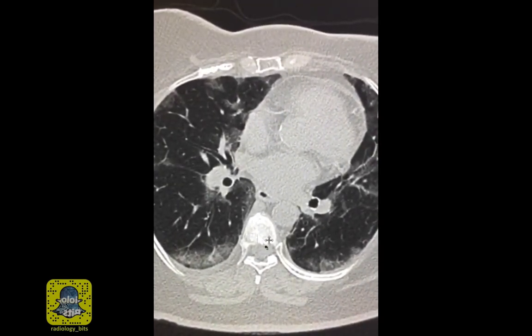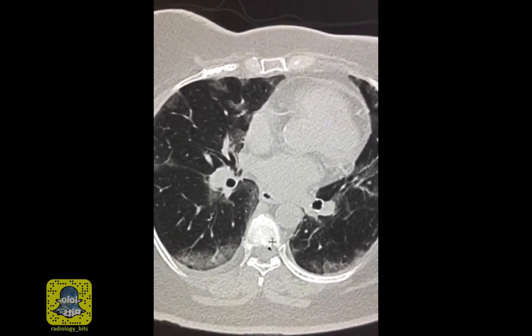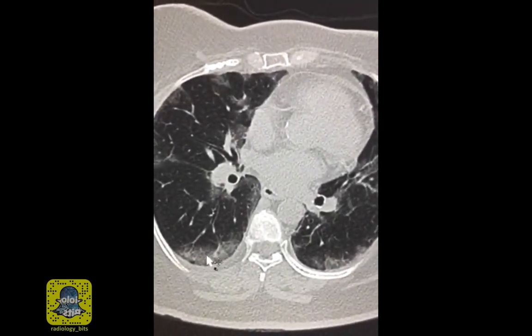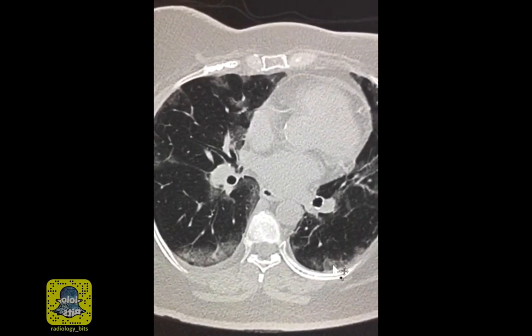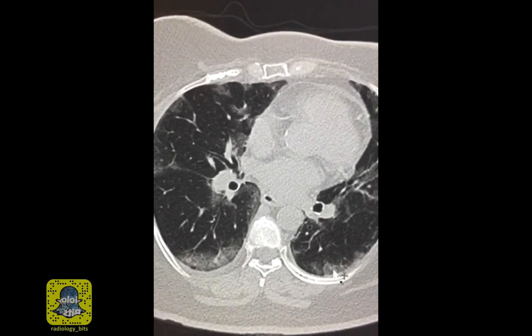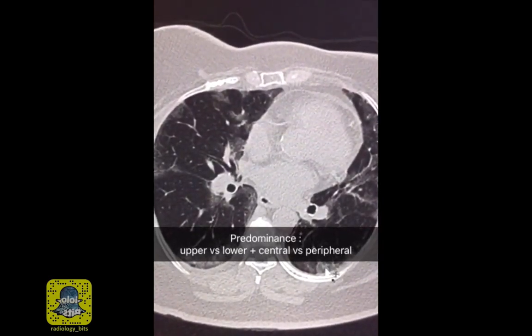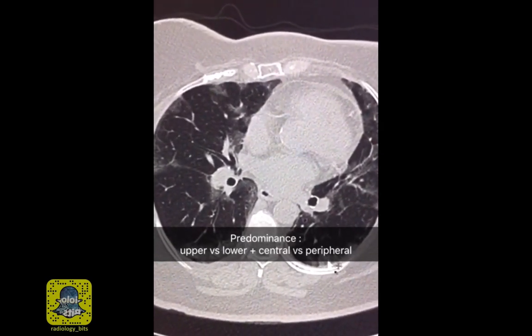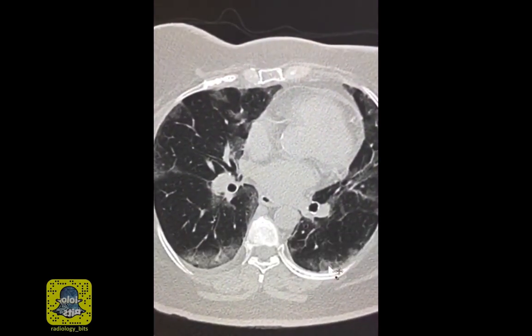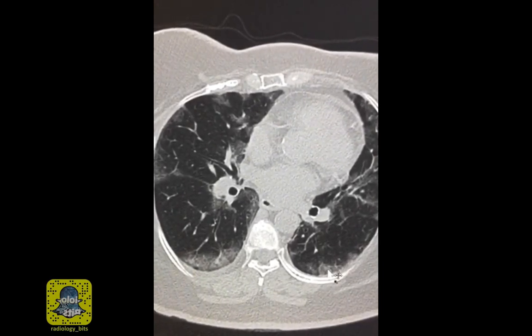Now that you decided that ground glass opacity is the main abnormality, mention whether the abnormality is unilateral or bilateral. It's obvious here that the abnormality involves both lungs, so this is bilateral. Now talk about the location. You have to decide on the predominant location. By that we mean you have to decide if the abnormality is upper versus lower or central versus peripheral in location. Sometimes the abnormality is so diffuse that you cannot decide, but in this case the decision is easy.